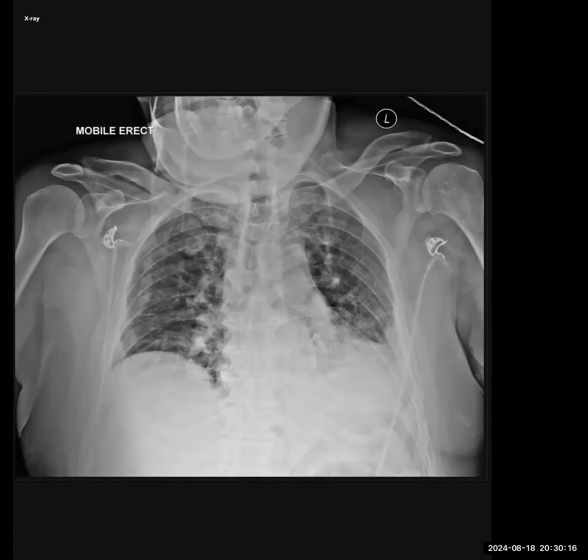So I would immediately pick up the call and inform the treating physicians regarding this collapse, and an endobronchial retrieval of this foreign body needs to be done. And I would convey these findings to the referring clinician.